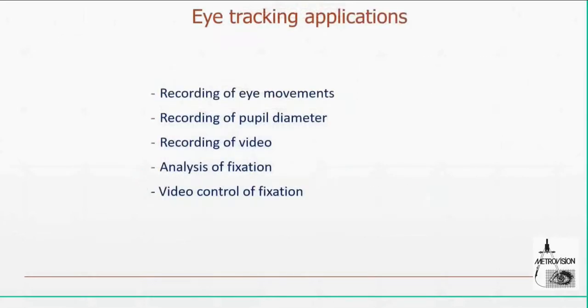It's not as good as getting the eye fundus image in real time, but with some experience, it gives you an accuracy of about 3 to 5 degrees, depending on some factors. But it also does allow you to evaluate quite reliably the stability of fixation. So we can record eye movement during all exams, during perimetry, static or manual, during dark adaptation, during other tests.